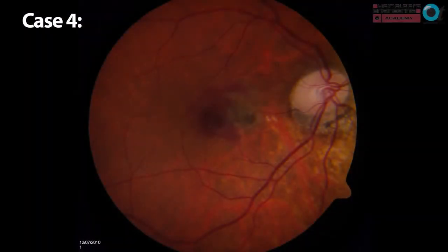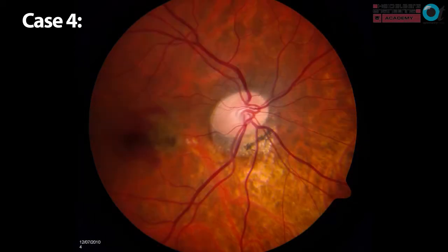So this is a colour fundus photograph of a patient with a sudden drop in vision in that right eye with a blind spot. And as you can see, you've got a large macular hemorrhage that's beneath the retina, beneath the retinal vessels centrally. And then nasal to that, you have a grey pigmented lesion, which is probably the choroidal neovascular membrane. And you can see it's a myopic eye because you can see there's a tilted optic disc with a small myopic crescent inferiorly.